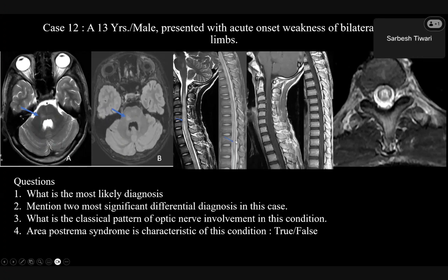All right. So we have already discussed the findings over here. These are the differentials where it talked about NMOSD, ADEM, and sarcoidosis. We will not keep MS as a differential in this particular case. There is bilateral anterior involvement, and we have discussed.